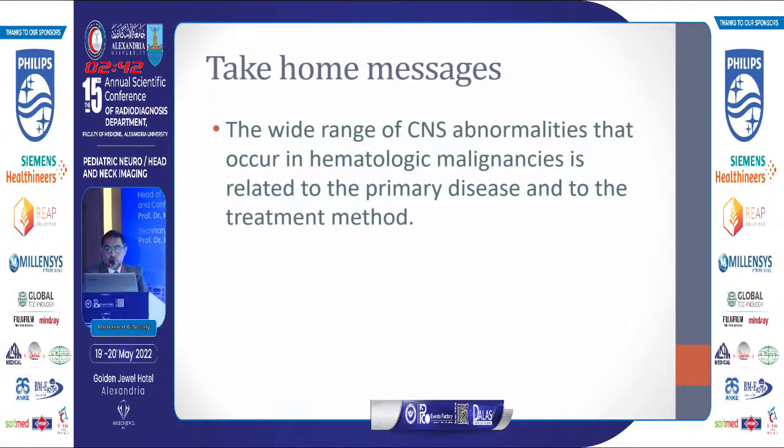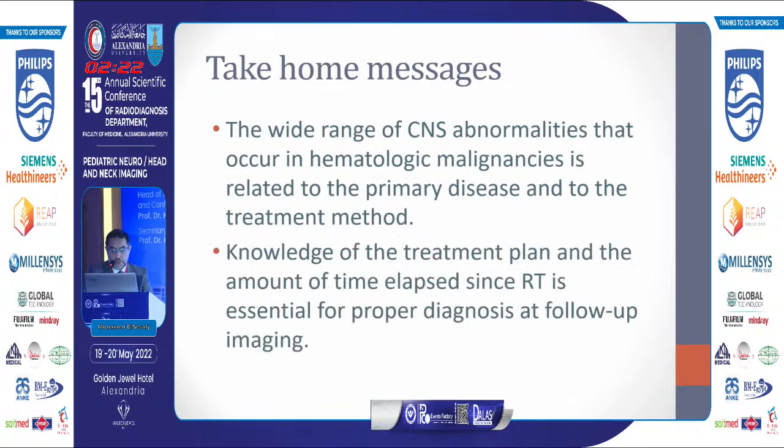So the wide range of CNS abnormalities that occur in hematologic malignancies is related to either the primary disease or the management or treatment method. The radiologist should be aware of the manifestations of the primary disease and the complications of therapy. Knowledge of the treatment plan and the amount of time elapsed since radiotherapy is essential for proper diagnosis at follow-up imaging. Thank you.